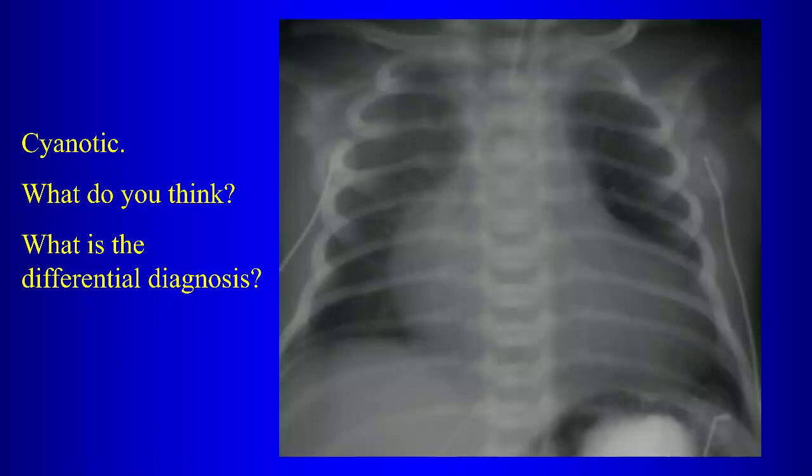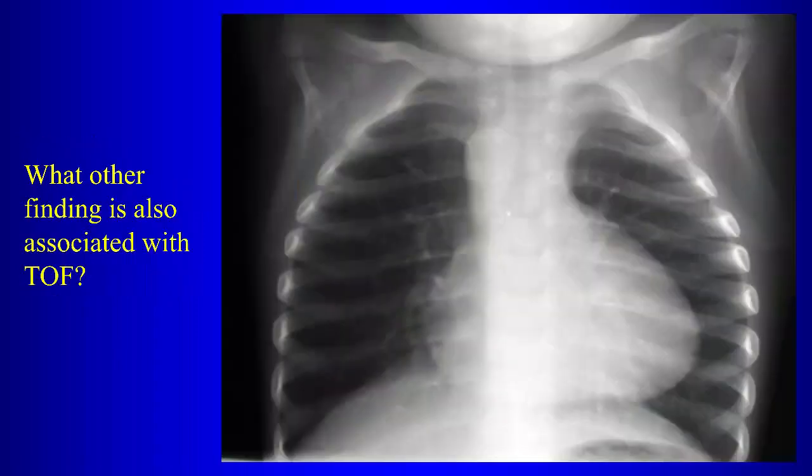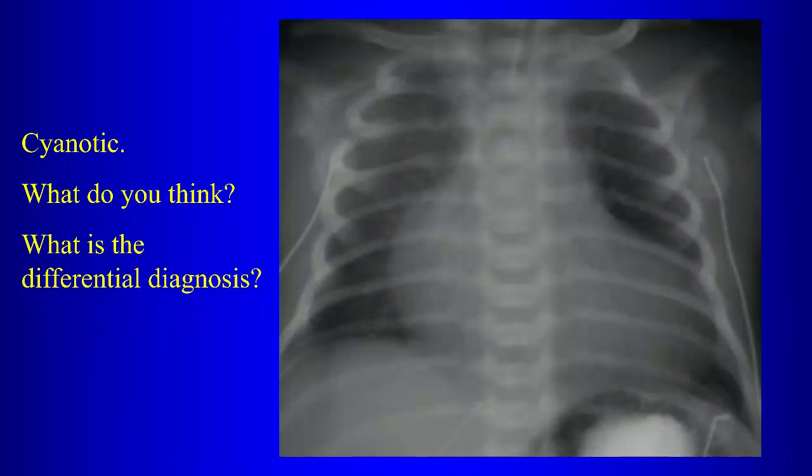Cardiomegaly. Yeah, here there's cardiomegaly, as opposed to the case of tetralogy of Fallot. There's near normal heart size. Here there's cardiomegaly, and especially what chamber appears enlarged? Right atrium. Yeah, the right atrium appears enlarged here, okay?